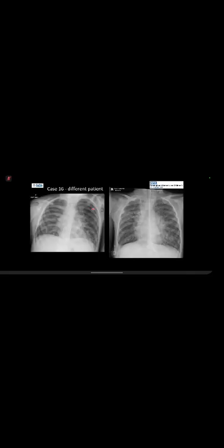So cystic fibrosis is a common condition which has bilateral bronchiectasis in children. And it affects the middle and the upper lobes predominantly. You would have the tubular markings and then the finger-in-glove sign. So always think about it. This is a multisystemic disorder, so you would have to look at involvement of other organs like the pancreas. In the liver, it can cause biliary cirrhosis, fibrosis. Look at the paranasal sinuses for mucosal thickening.